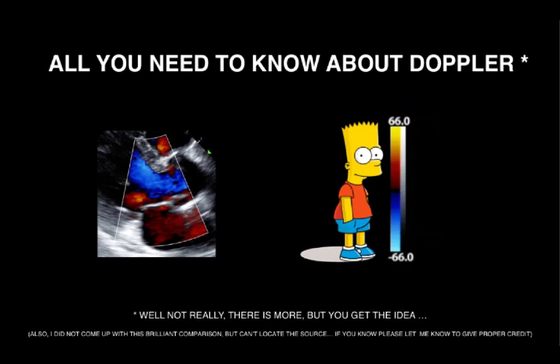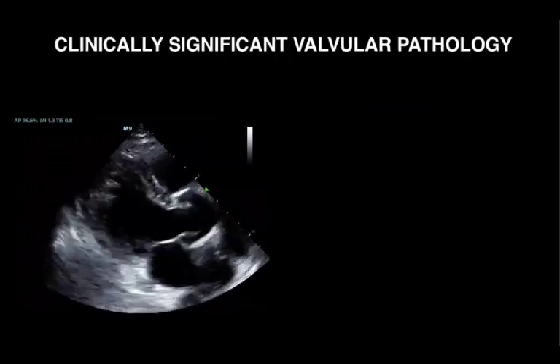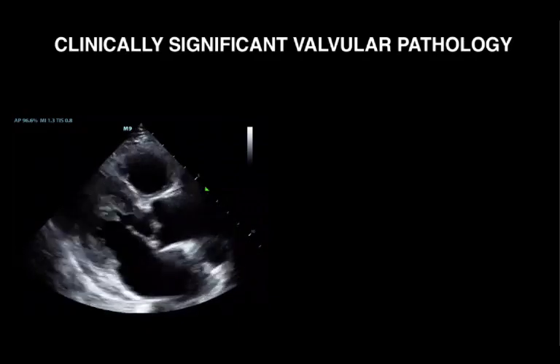You need to understand Doppler. And in order to do that, remember this guy. Yellow top, red at the center, blue at the bottom. Blue is away, red towards the probe. That's basically guiding you on how to interpret this color mapping. And the yellow is aliasing. And we really care about mostly the mitral valve and the aortic valve.